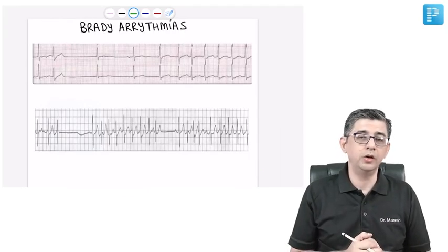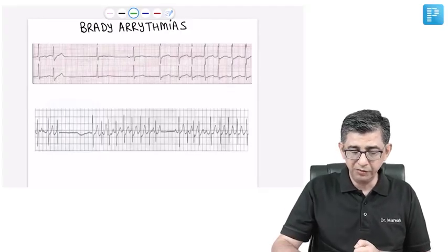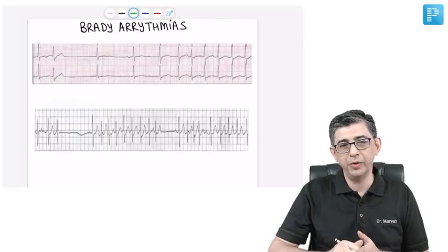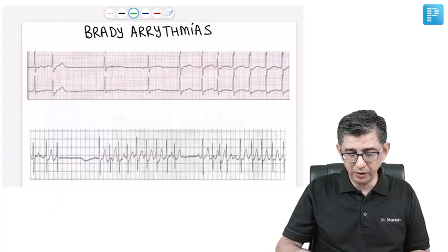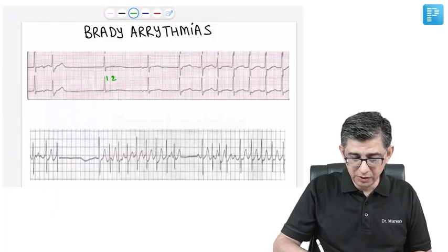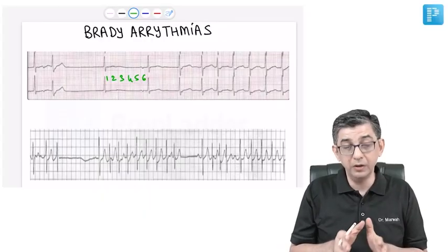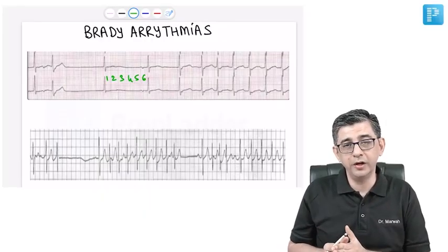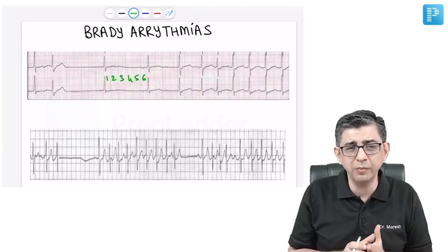Now we come to another component of the ECG, that is to talk about bradyarrhythmias. I personally find them very fascinating and also relatively easier to comprehend. Because when it comes to bradyarrhythmia, the number of squares between the R and the R interval are so many that it gives you a breather actually. You get the opportunity to evaluate simultaneously. While you are counting this, you will also be looking at, is the P wave present?